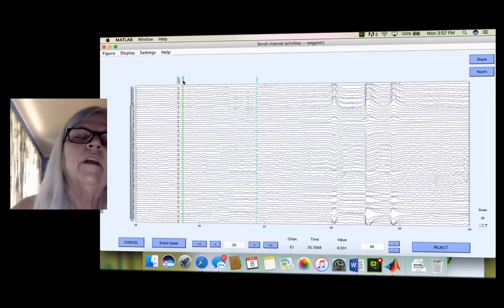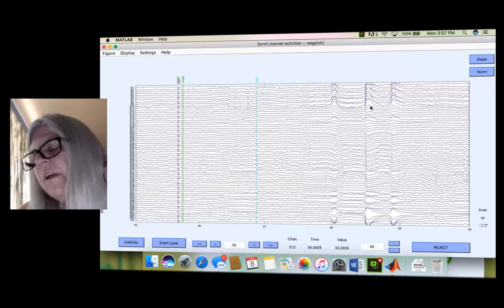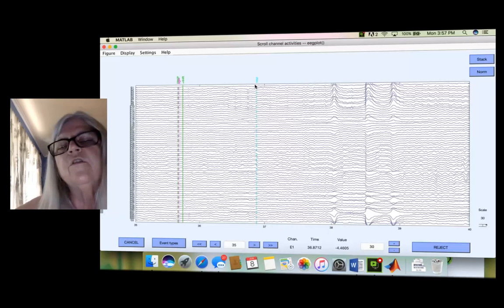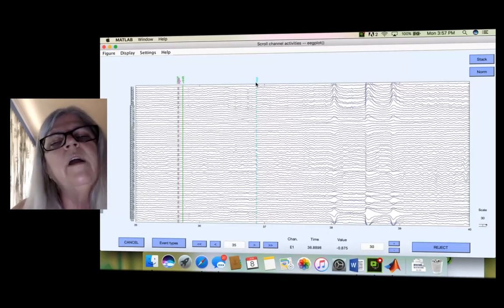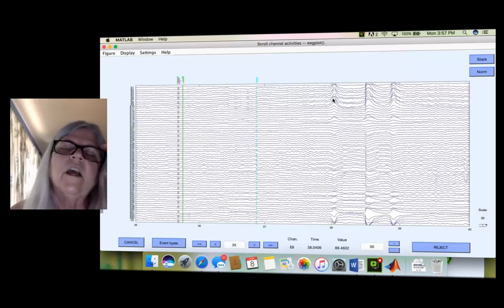But what you don't know that I know is I'm looking between the stimulus and the response, and I notice that this occurs after the response. So typically when I analyze these signals, I'll take from the stimulus about between half a second and a second. Once the person has answered the question or responded to the stimulus on the screen, it is not uncommon right after that to see eyes move. Because what they do is they relax a little bit. They maybe look down, they maybe blink, they maybe take a deep breath because they've paid attention, they've seen the stimulus, they've given their response, and then a lot of times they will relax.